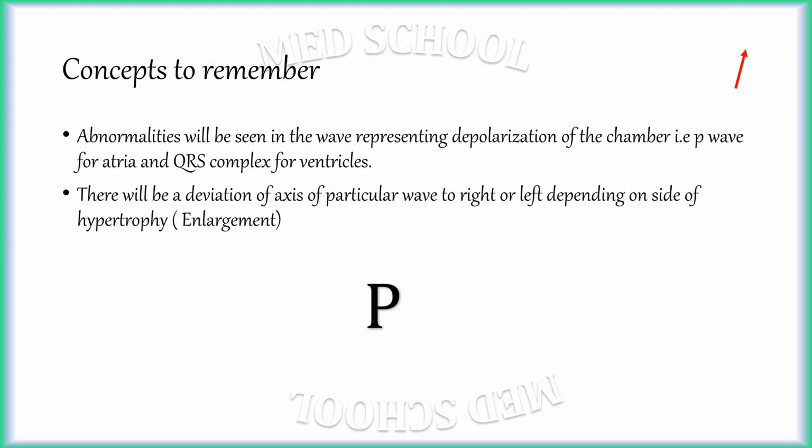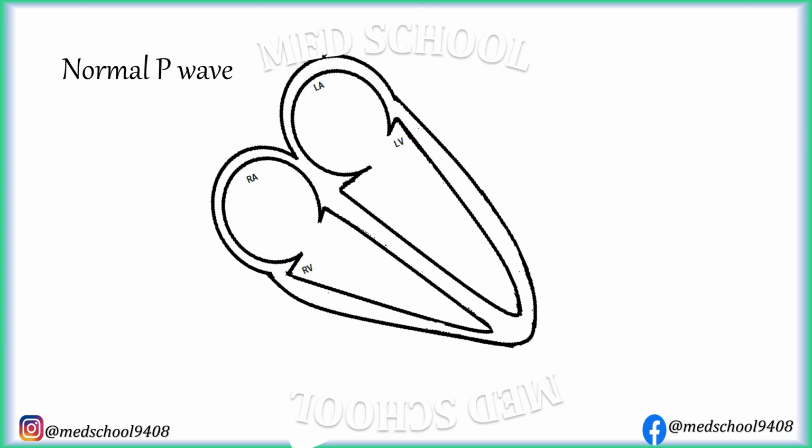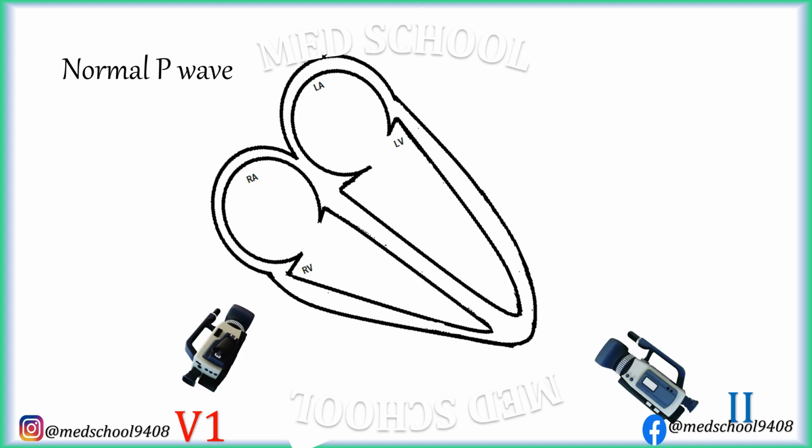I would highly recommend to watch basics of ECG first to understand this video better. Let's see how P wave is formed. P wave is best studied in lead V1 and lead 2.